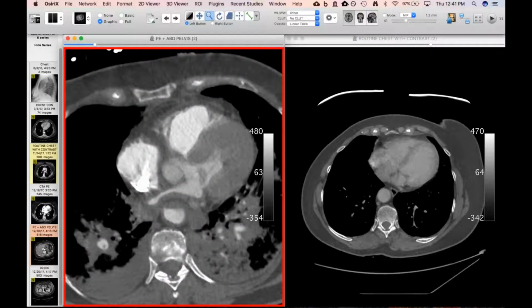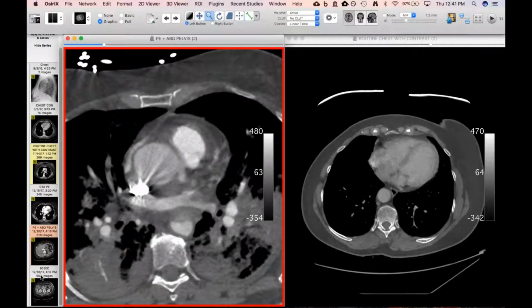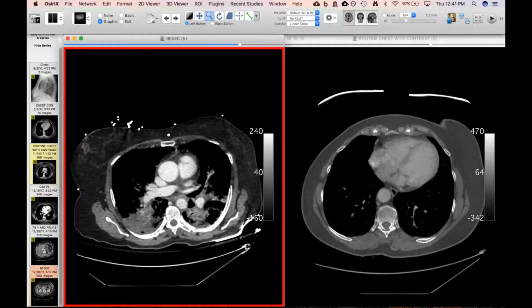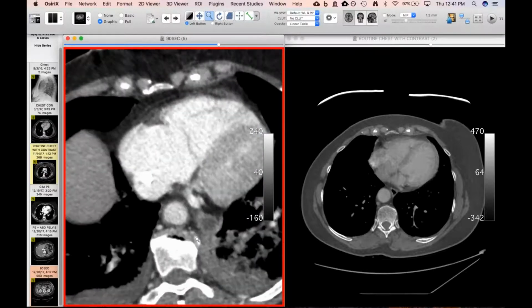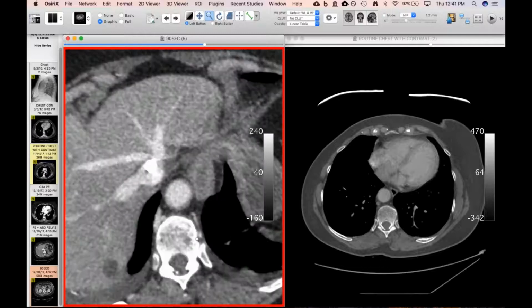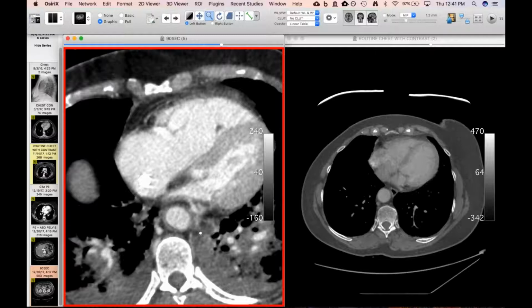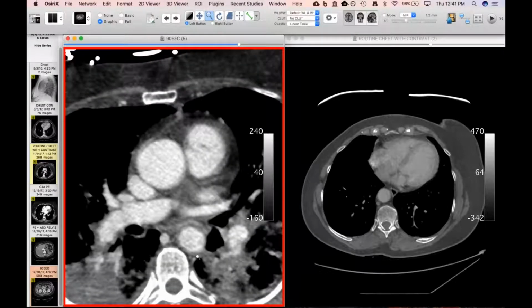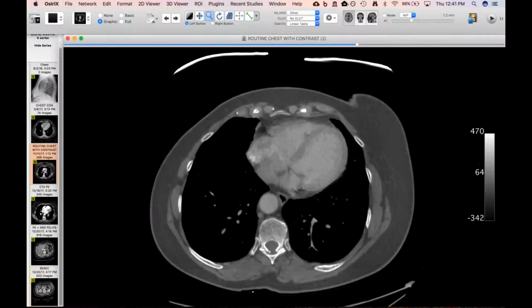And it just so happened because she was on ECMO and they weren't sure if they were going to get an adequate PE study with the ECMO, that they went ahead and did a 90-second phase. And you can clearly see that the smoke is gone. So it was just a contrast fluid level in the aorta. So another nice artifact. I think this one may be just more gravity dependent filling due to her reduced cardiac output. So cool. Yeah, just a nice collection of multiple things.